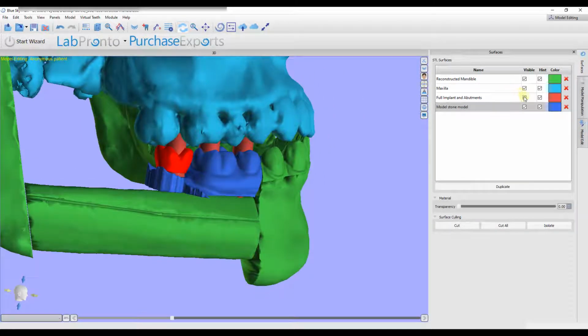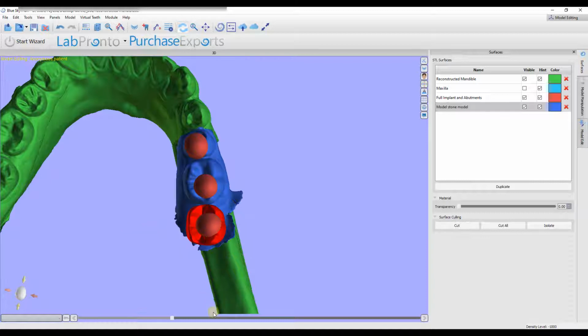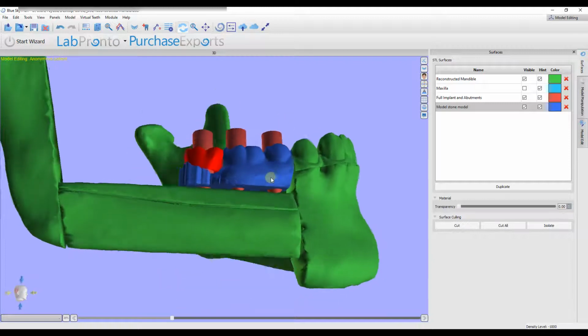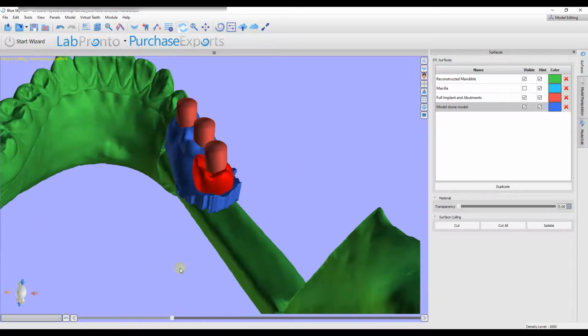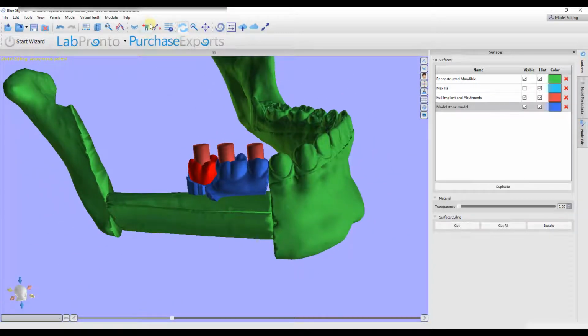And the big thing is I'm just going to make it short because this entire blue prosthesis, we want to make it a little bit short so that it's out of occlusion during the healing period here. And I'm going to do something like that. And it's a little bit shorter than the adjacent tooth, I think. So we'll go with that. I'm going to lengthen this to pull it down into the model. So it's touching the model. Good.